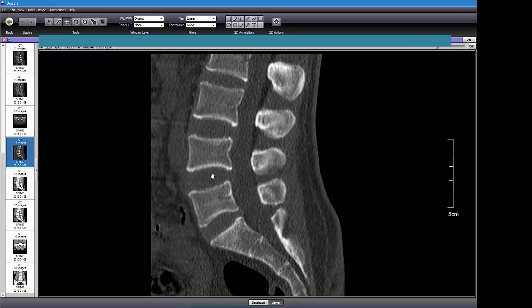And the discs, now we can't see the discs very good on CT, but we can see these big spaces. Remember, these are really abnormally large spaces we talked about in the last video. So vertebral body. Now, this is a cut right through between the pedicles. We can't see the pedicles, but we can see the central vertebral canal here, central spinal canal. And it's a little narrower than normal, but it's not bad. It's a good looking canal here.